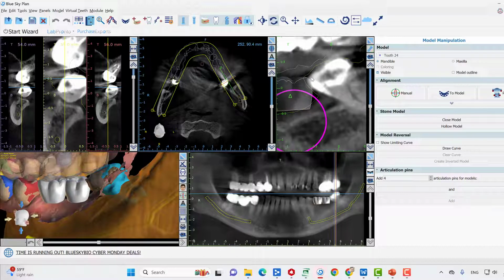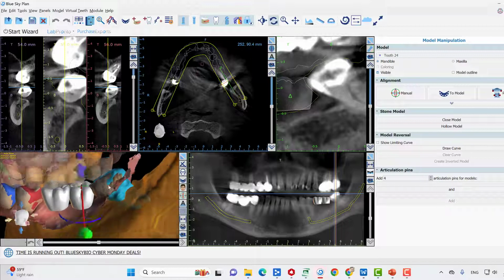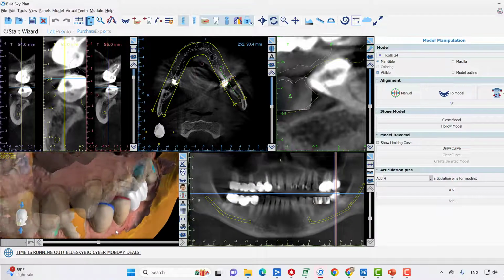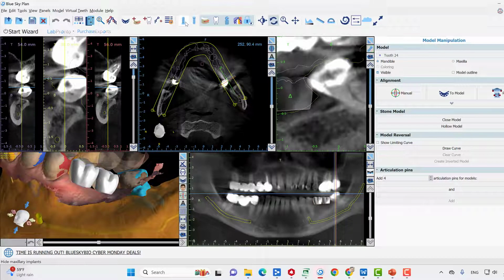So what I'll do is I'll shave off about 1 millimeter or 2 off this crown that's on the posterior. That will give me two things. It'll both give me space and give me a broader contact point. Both will be helpful for no longer causing a food impaction there. So if you see here, I made this tooth a little bit bigger than the tooth is now, because I plan on prepping that tooth down and leveling that off slightly. So we've got our teeth in occlusion, and now we can plan our implants.